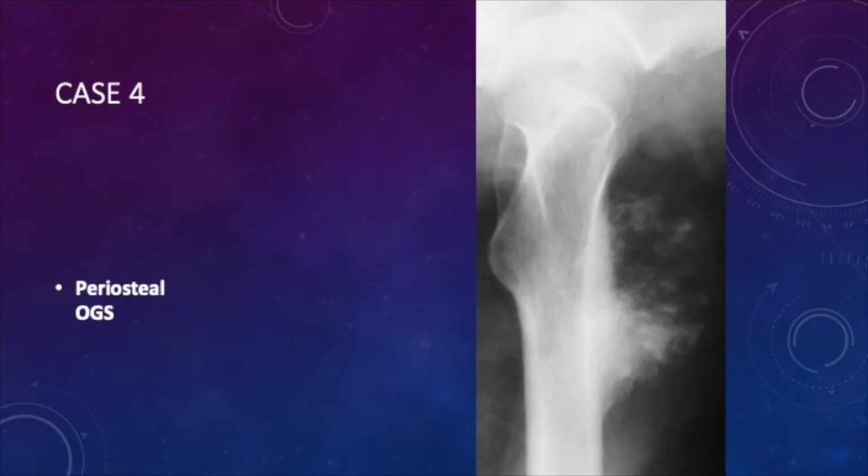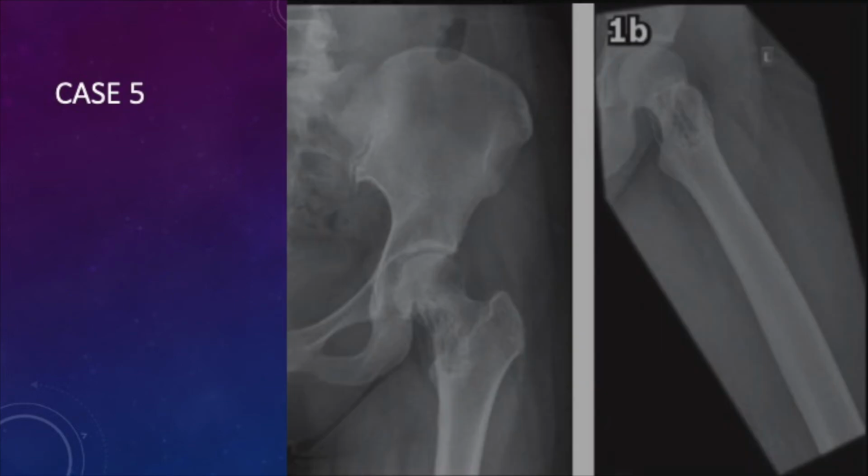So we have a stuck-on lesion on the surface of the bone with cloud-like ossification and osteoid production with no frank destruction or obvious intramedullary involvement, and that is usually going to be a periosteal osteosarcoma. Here's our next bone lesion.